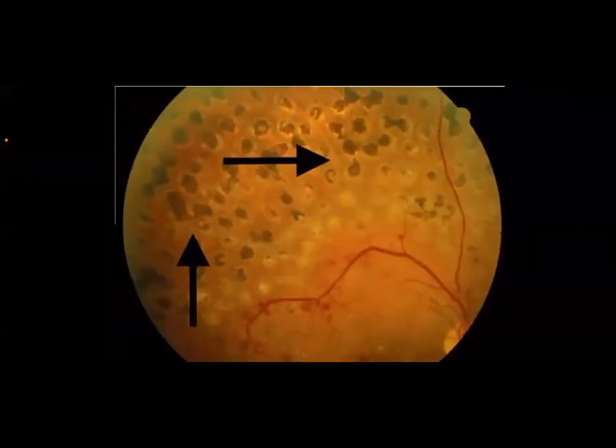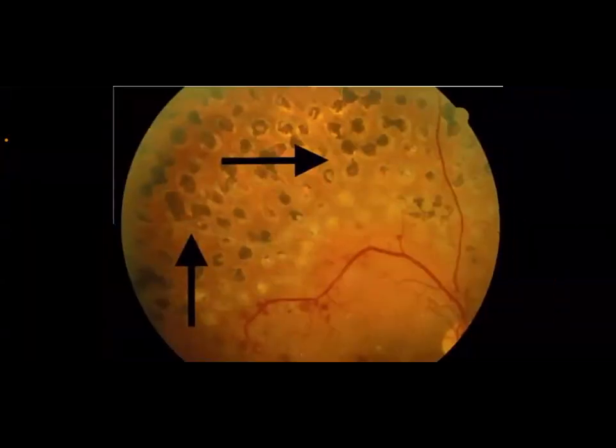So this is laser therapy. This is also laser therapy again. The difference is this is well organized, not like retinitis pigmentosa. First, it will not be rounded. It will be like a bony spicule. Scattered bony spicules, dark color, black color.